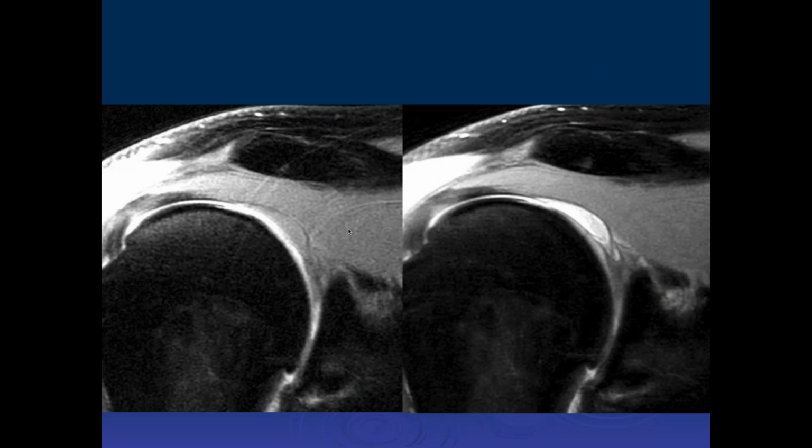Okay, Sam, what do you think of this case? Looks like the superior labrum is torn and probably dislocated posterior to the glenoid. And why do you say posteriorly dislocated? What is that? These are coronal images. So this is down. We don't really have any posterior images here. I'm sorry, not posterior, I meant medial to. You mean this thing over here? Yeah. What is that? This is a fat suppressed image, so that's probably fat that's suppressed.